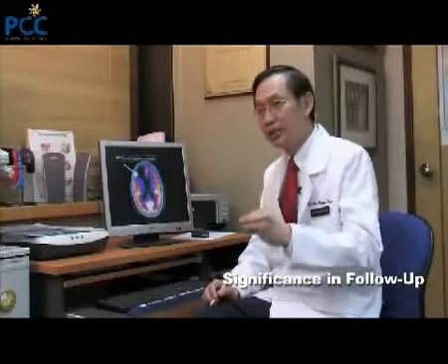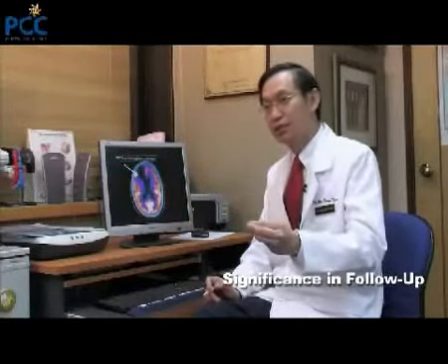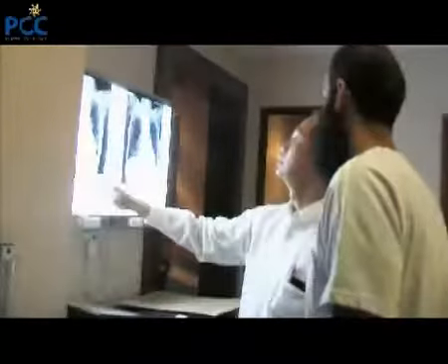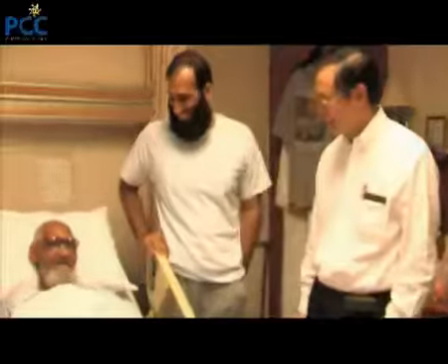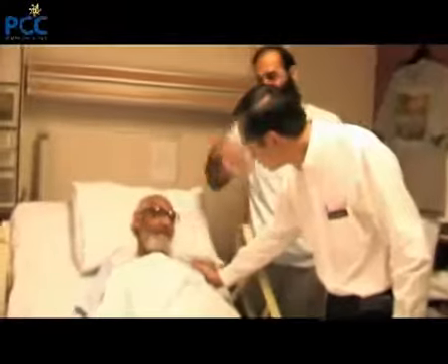Besides helping us in staging the cancer, meaning what stage it is, whether it's metastasized or not, and number two, in terms of helping us determine whether the tumor is responding to treatment, that is a before and after picture, the PET scan is also useful in helping us to follow up a patient, to determine whether a patient has or does not have a cancer recurrence.